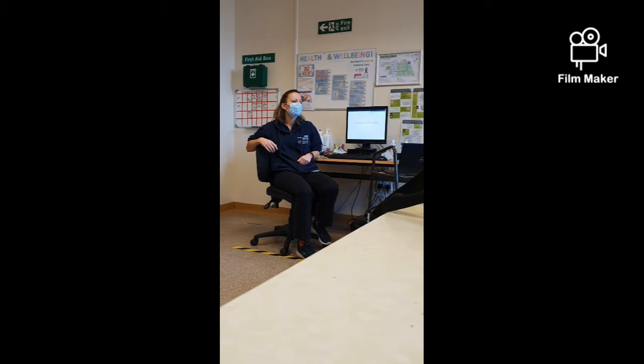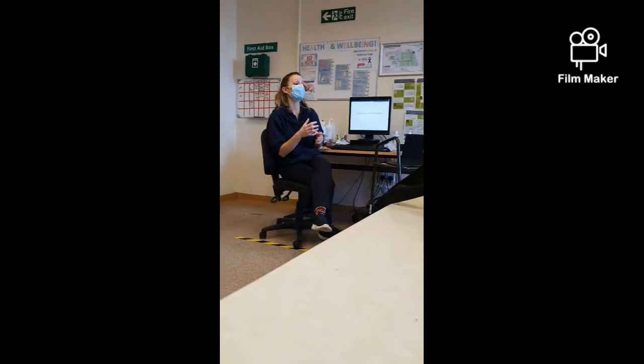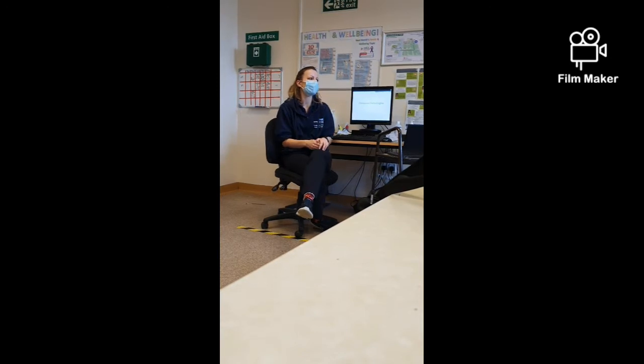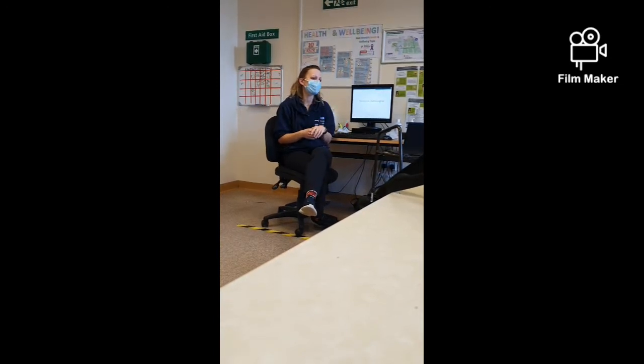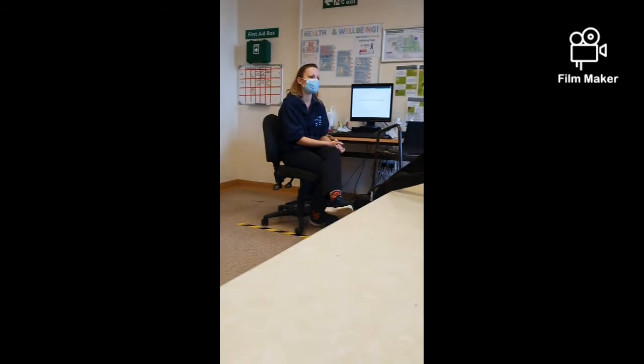pneumothorax and hemothorax, how do they differentiate in there? So your pneumothorax is just air, your hemothorax has got some blood in, but they would tend to show very similar. You would have a black space on your chest x-ray with no lung markings, and you would have a deviated trachea. On a hemothorax, if there is a collection of blood, you may get a little bit of white at the bottom where the blood's collecting, depending on the position they're in. But on the whole, it would be a black area on your chest x-ray.